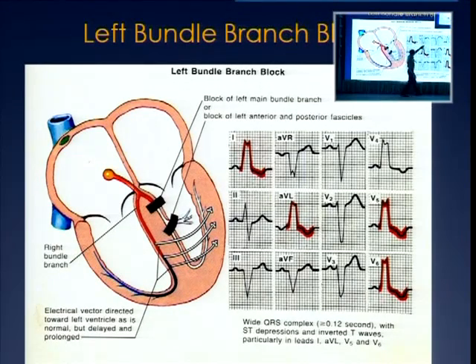That initial small little bit that you see here, in many ECGs of left bundle branch block, you will find this is quite narrow. And that is because this initial activation of the right ventricle through the Purkinje fibers is represented by this tiny R. So initial activation is normal, and then terminal activation becomes broad as the impulse plows through cell to cell to cell, and then once it reaches this area, it becomes faster once it gets into the Purkinje system.